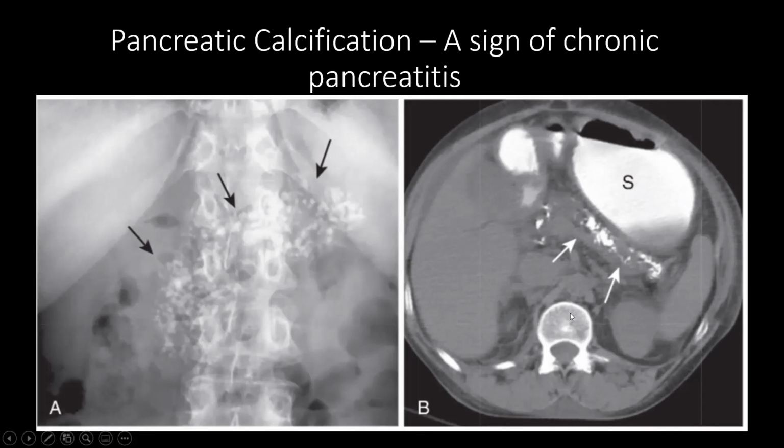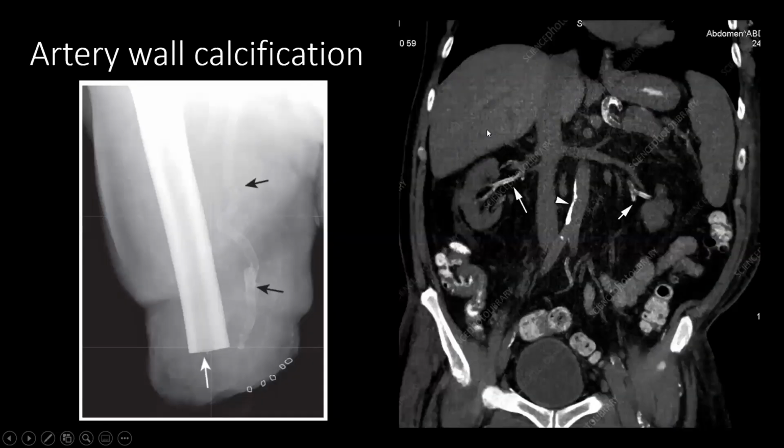explain this CT. Now, this CT scan, as you can see, this is a thing filled with air, and here I have an opacity. This is opacity of the oral contrast. The oral contrast appears as hyperdensity. Okay, so here I have the stomach shade, here I have the liver shade, and here I have the spleen shade. Okay, and here is this kidney. Because this is not given IV contrast, I'm not giving any contrast in the veins, it's not that much apparent or appreciated, only oral contrast is given. So this shade here is the shade of the pancreas, or this is the organ site of the pancreas. That's why this is the sign of chronic pancreatitis, which is the calcifications.